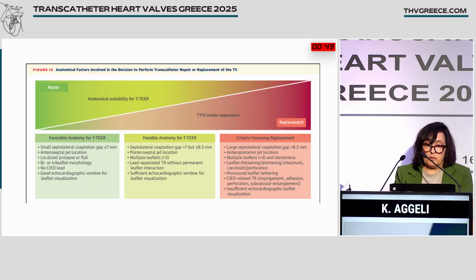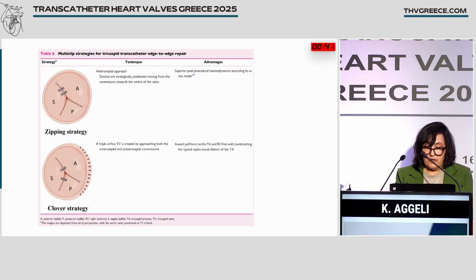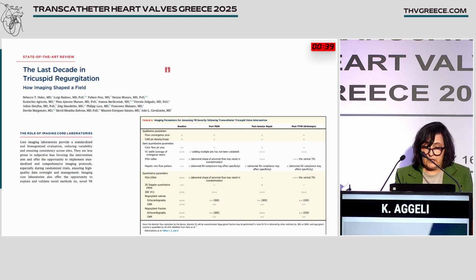Not only anatomical factors, but also center experience is involved in the decision to perform the TEER procedure. I would skip this. It's very important to evaluate the post-TEER procedure residual TR.